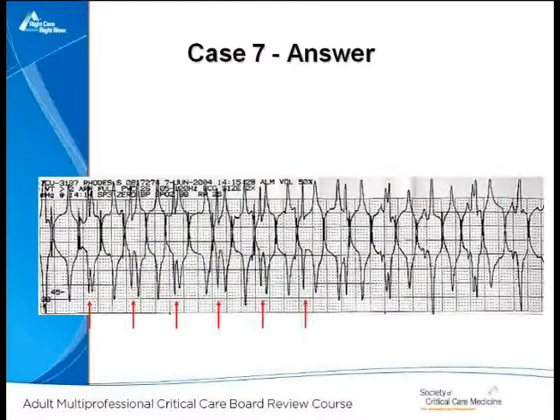And when you see intervals like this, you can't have two QRSs 30 milliseconds or 60 milliseconds apart. It's just impossible. But if you march this out, he is a little tachycardic. His heart rate is 110. But those are the QRSs. This other stuff was him, and I don't know whether he was brushing his teeth or scratching his electrode or what he was doing, but this was thought to be a rapid ventricular tachycardia, and it actually was an artifact.